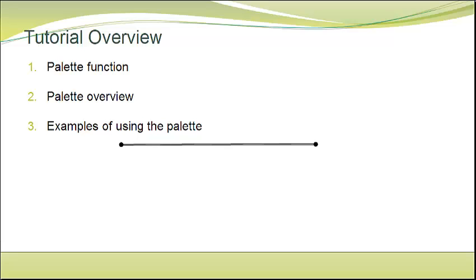In this tutorial, we will review the palette, the graphical tool used to graphically set the crown and root of any tooth, whether primary or permanent. We'll review the function of the palette. We'll go through an overview of the arrangement and finish with 3 examples of using the palette.